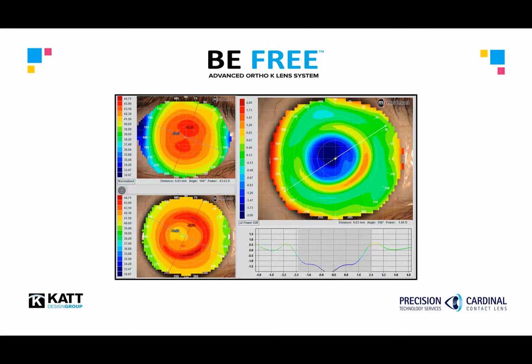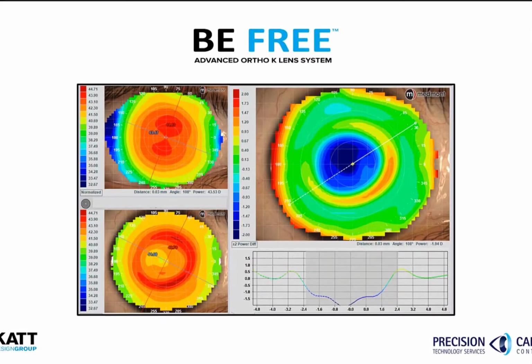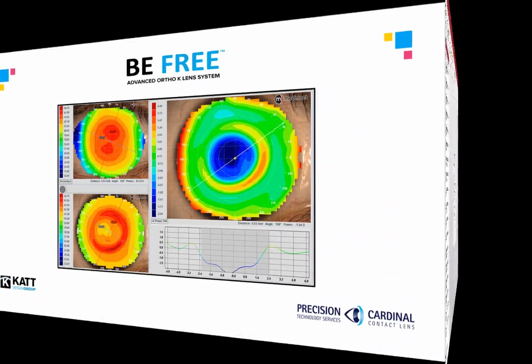Let's review the first of two cases. Here we have an ideal Bullseye topographical response following BeFree lens wear. However, after more than a week of consecutive nights treatment, the patient is undercorrected. Let's review how simple it is to resolve this case.